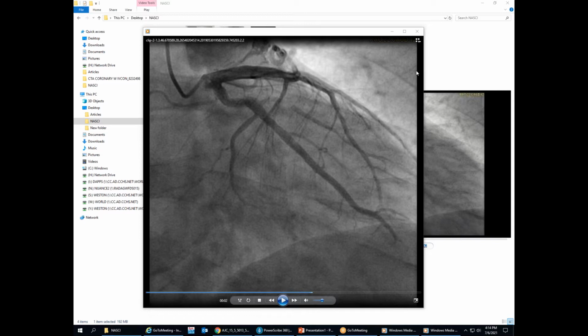So the people that I've talked with, we kind of believe that it's very hard to say that a patient has a non-compacted cardiomyopathy when you have a dilatation of the left ventricle, just because of that. So if your measurements are borderline at best, I probably would just call it dilated cardiomyopathy, either ischemic or non-ischemic, but I would just call it that, and I would not necessarily discuss the non-compaction part of it.